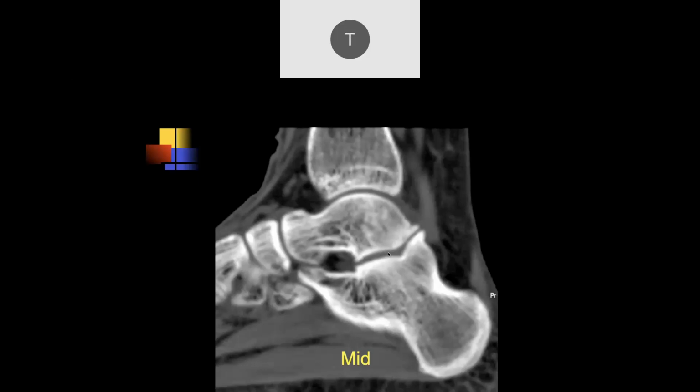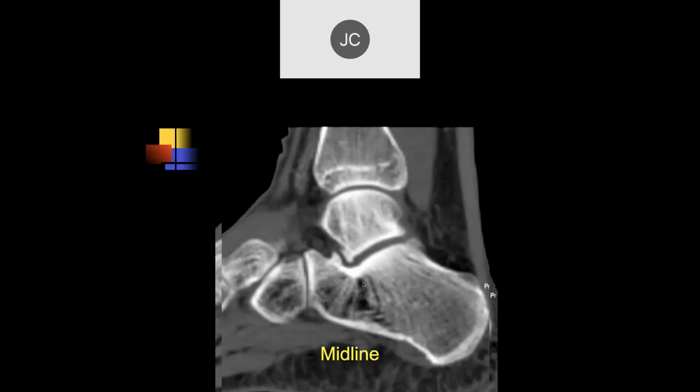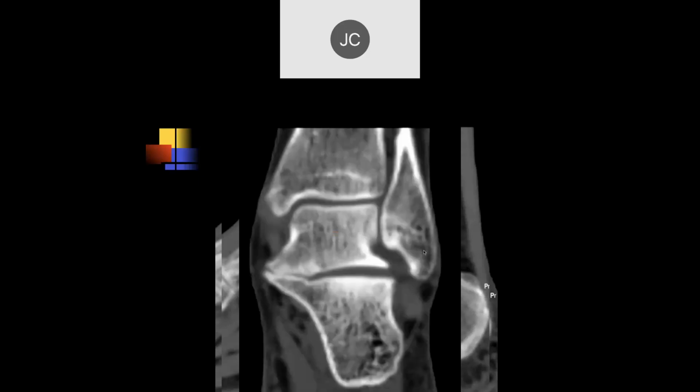There is kind of this angulated articulation that I feel like we don't usually get. So it really looks like the posterior and middle facets are kind of contiguous with one another. And we bring it all the way in through here. Here we can see some marginal osteophytes, a lot of eburnation of the subchondral bone, and there are those marginal osteophytes. If we go to the coronal plane, it looks like this.